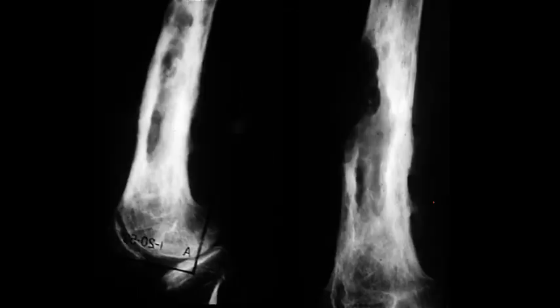Another example, here's more of an older individual. So this one does have that sclerotic change. And I don't know how well you can see it here, but there's a couple arrows in this region pointing to kind of this area. So this whole area right here should have bone still. Again, as I mentioned, chronic osteomyelitis, we expect to see thickened cortex and more bone.